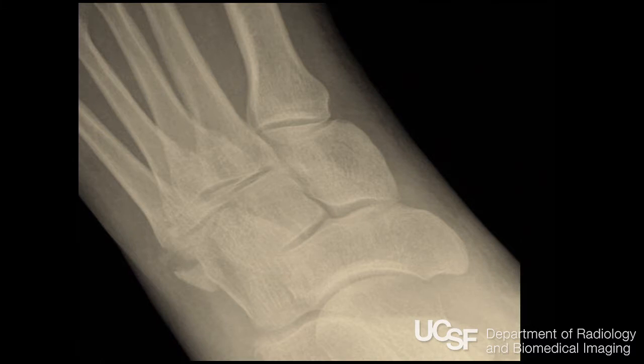Metatarsal fractures, fifth metatarsal fractures, there are a couple different varieties of this. They get treated differently. And you'll get a call from the emergency room saying, oh, is this an avulsion injury, or is this a Jones fracture, or is this a dancer's fracture? The best thing to do is describe the anatomy, because there's a lot of confusion out in the clinical world on what to call these things.